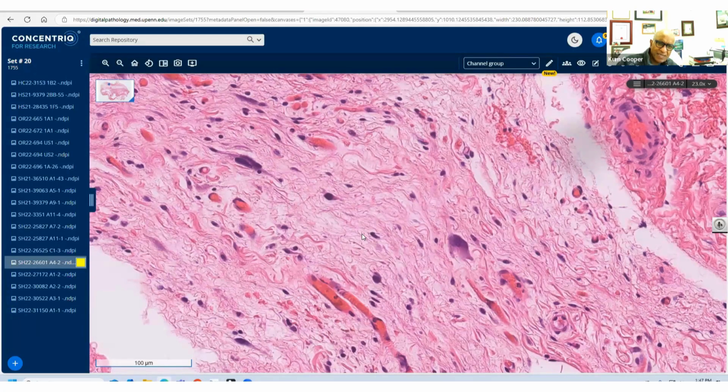Now, the next question then you'd be asking, Florence, in Nairobi, Kenya, is if you saw this now in your practice out there, you would say this is not a spindle cell lipoma. Even if you did the RB1, which is lost, it's not discriminatory. Some of them are S100 positive, and typically the spindle cells are CD34. None of those are discriminatory from a well-differentiated liposarcoma. So the atypia, the morphology tells you this is not spindle cell lipoma.